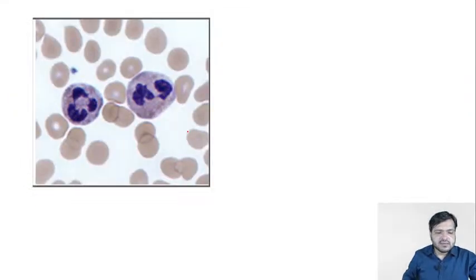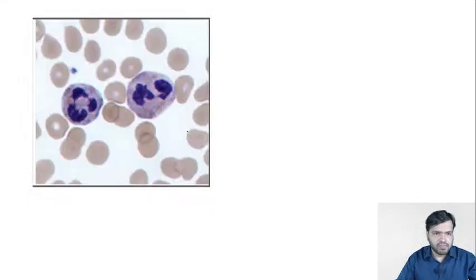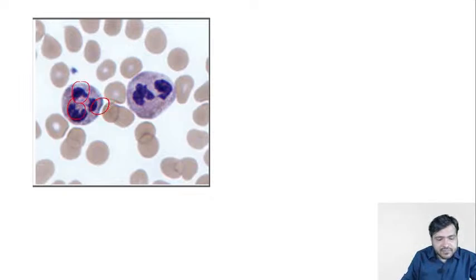Apart from that, guys, now coming on to the next image. You can very well appreciate that this particular structure is of a neutrophil. It is actually of a neutrophil, guys.